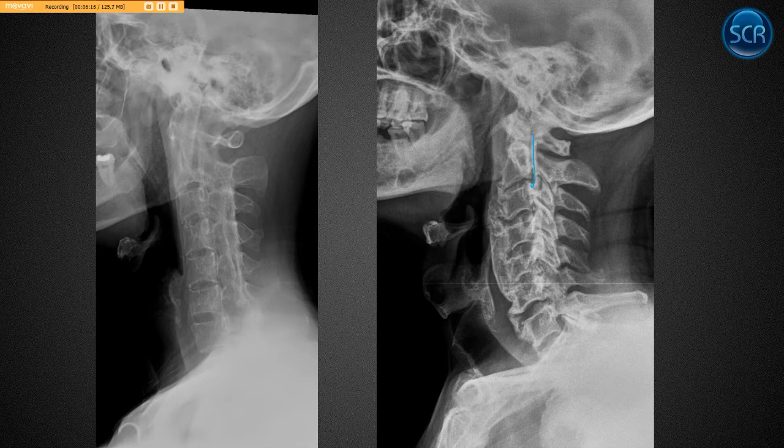So we start up here, normal, go down here, oh, not normal. Okay, so we've got this PLL calcification here. And so, of course, that's narrowing the central canal because it should be this big, and now it's this big because there's ossification of that PLL. So that one, of course, requires further imaging, probably a CT scan, and maybe an MRI to look for the degree of cord compression. And they may need decompressive laminectomy, so maybe a neurosurgical consult would be warranted in this specific case just because of that PLL calcification.